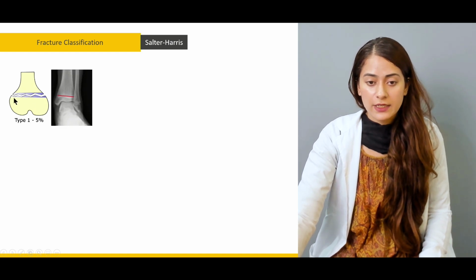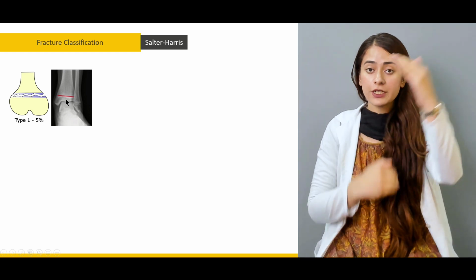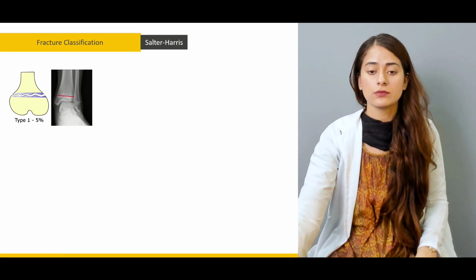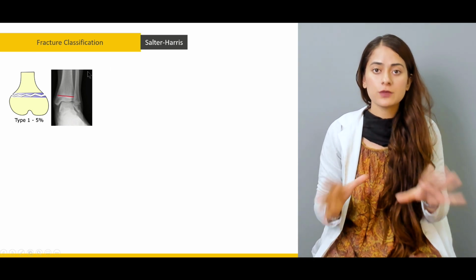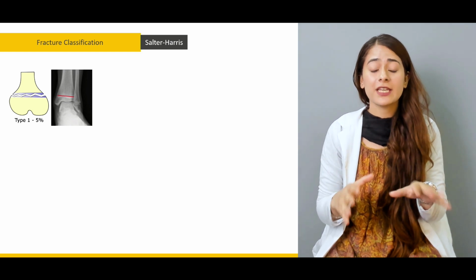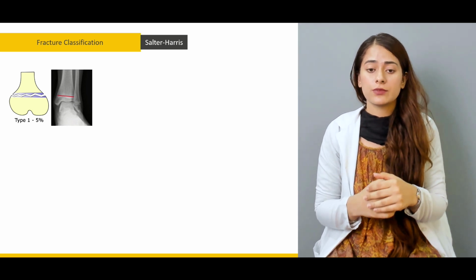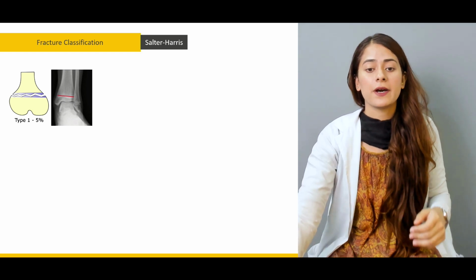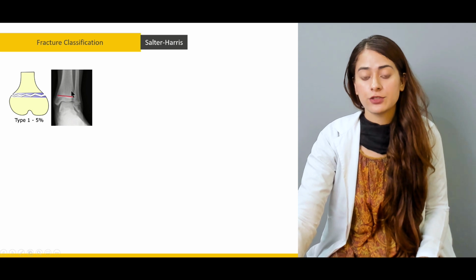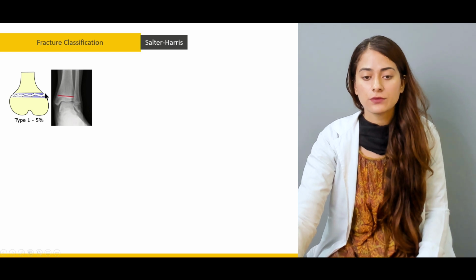So this is the epiphyseal plate. The epiphyseal plate, or the physis, or the growth plate, is responsible for the longitudinal growth of the bone. Because the bone is not susceptible to shaft fractures, because like I said, the periosteal layer is thick, if there is a very intense or stressful condition, the resultant fracture is probably going to be an incomplete fracture or a greenstick fracture. But epiphyseal fractures are common in young individuals or children, for that matter.